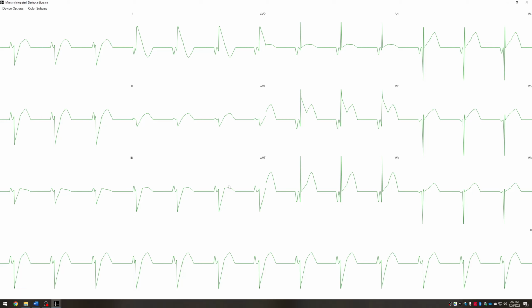You could do a screenshot of the device as it is on a white background. So I'm going to pause and reload so that we can get a new situation, a new simulation running to show some more of the features of Infirmary.